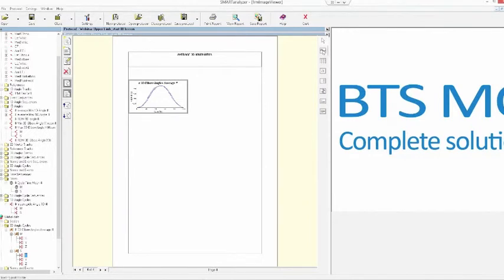Okay, the second box will contain the Y component and also the standard deviation. And I will add also the third, so again the mean and the standard deviation.